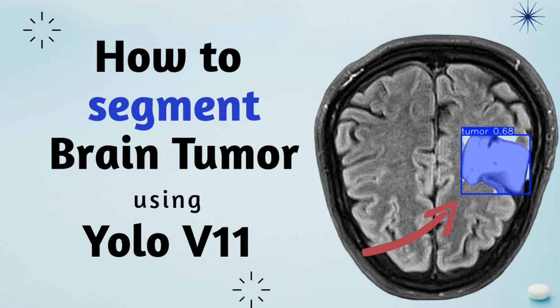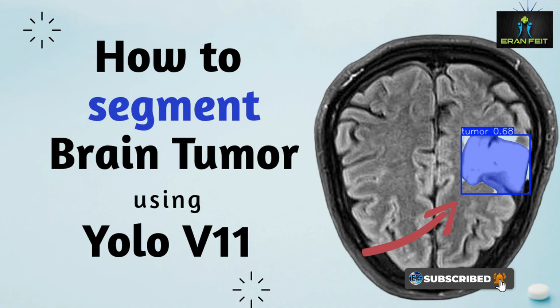Hi, welcome back. In today's tutorial, we're diving into brain tumor segmentation using YOLOv11 and Python. We will start by training a segmentation model on a brain tumor dataset, then move to running inference to detect and isolate tumor regions from medical images.